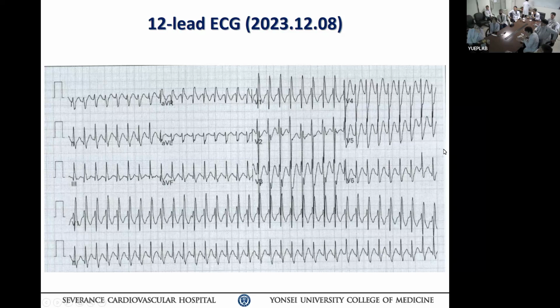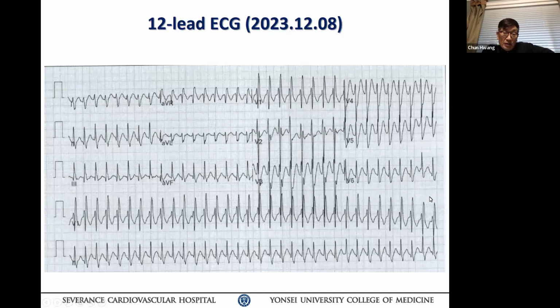So what does that mean? If this is an aberrant SVT or VT, which one most likely has different patterns of a Q wave at the beginning? SVT or VT? 왜냐면 그 QRS morphology가 change 되는 거는 there's a possibility of there's another complex lying on top of it from time to time. Am I right? Summation effect가 돼서 그렇게 되는 거 아닌가? 그렇지 않으면 QRS가 바뀔 수가 없지. 어베런시는 똑같을 테니까.